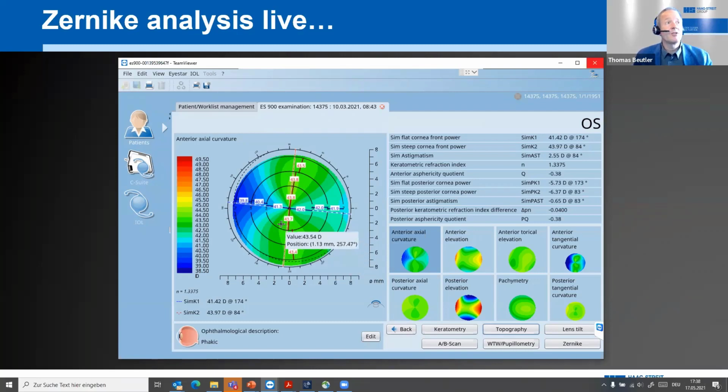Reflective keratometry just looks at the two rings at 1.65 and 2.3 millimeters. So that's a very limited area we are looking at. The simulated keratometry looks at the whole cornea in more detail because it's based on the elevation data. That's why you have some differences. What to rely on if you have big differences?